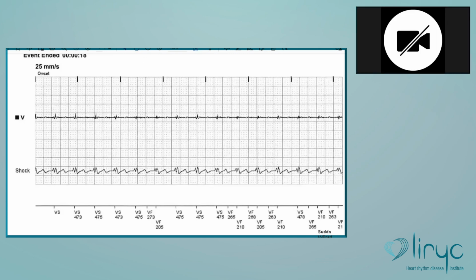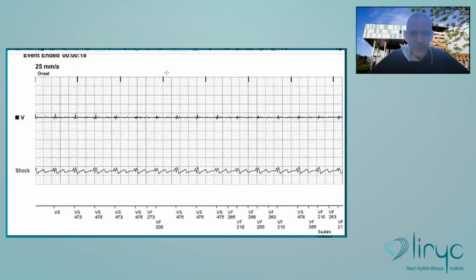I think you're right, Pierre. It's mostly about filters, though. I think on Twitter, I've seen some cases of T-wave oversensing in Medtronic devices where they then performed a box change to Boston, and then the T wave suddenly disappears. So I put it in the chat. I don't know if you can see it, but it's two tracings. The first one is Medtronic with evident T-wave oversensing, and the second one is Boston, where the T wave is really small. So there were cases like that. That was my point of view, theoretical, but now it's become practical, you see, but it's really logical.